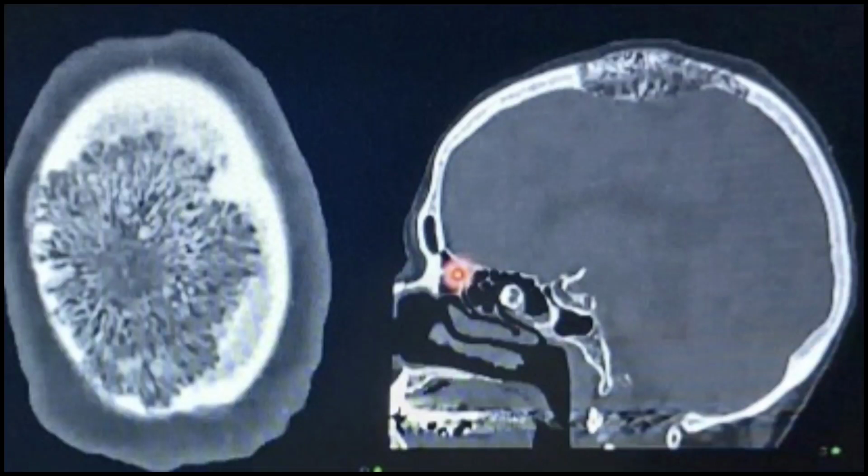On the skull, especially in this view, you can appreciate radiating bony spiculation producing a particular type of appearance which is called the sunburst appearance, and you can also see expansion of the outer table as compared to the inner table. So this is what you can appreciate in the skull hemangioma. You should not confuse it with any other abnormality. This is what the typical characteristics of the hemangioma are on the skull radiograph.